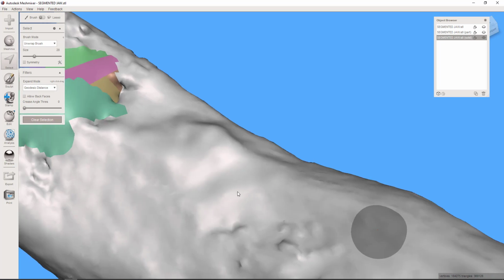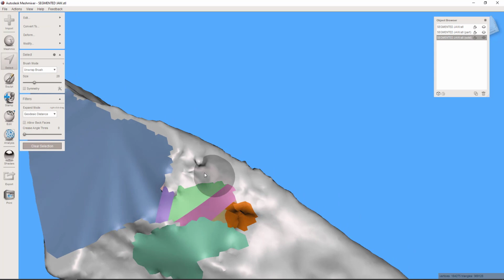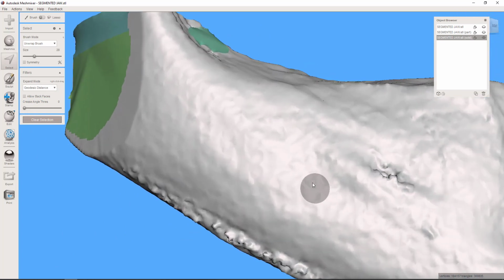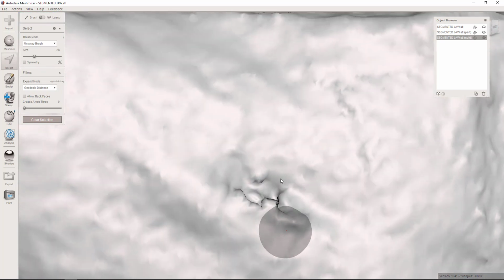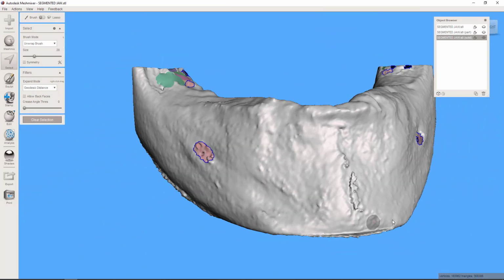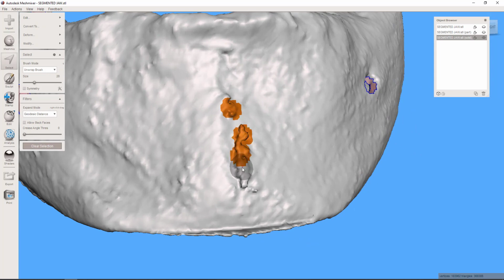Let's look for any over here. I'm not sure what that is, but I'd rather delete it and fill it in. So I'm going to just go ahead and get rid of them. This is probably going to be problematic. And even if that is a tiny void, I would rather it smooth it over for sake of a guide fitting. If you have little errors like that, you know, this is just distortion, you could delete those. You know, trim back the excessive areas or erase it.